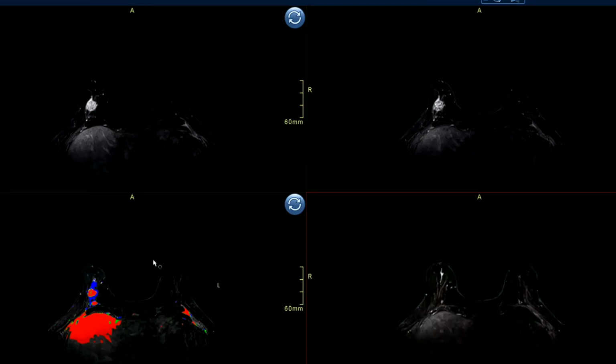And then you want to know what is happening. So this is a mass. There's no question this is a mass, but are you always presented with masses? No. You have so many things in the breast. Some people have fibroadenoma, some people have fibrocystic changes, multiple things. So everything is not going to be this simple. If I didn't have the kinetics here, I wouldn't care. I'm going to say a mass. But there are many things you don't even know what they are.